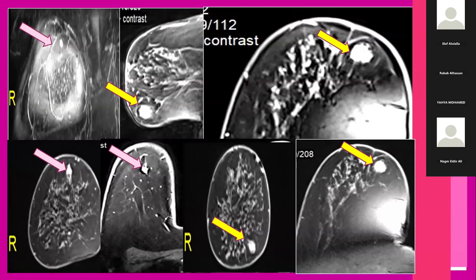This is her MRI, demonstrating margins that were non-circumscribed, and that is the extension we have seen on the mammography, with this linear non-mass-like enhancement. In the fat-suppressed sequence, this is the apparent capsule seen on mammography, and the underlying lucency here is devoid or suppressed fat component.